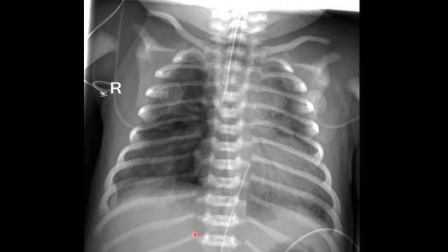So what you need to note here is the patient is lying on her back. Therefore, the pneumothorax is going to be at the most non-dependent portion of the lungs, which is in this case anteriorly along the sternum and anterior chest wall. Hence, the pneumothorax is going to outline the mediastinal contours and not the lung apices.